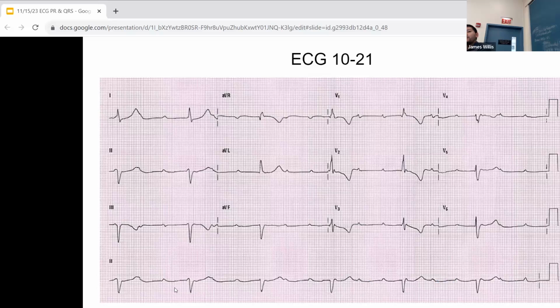So this would be great to determine in a patient. You could place the patient on telemetry and look to see if you can get more beats. Sometimes they'll have some grouped beats and you could determine if it's first or second degree. Then you'll know the difference. I would measure out the PR, and if it's the same, then I would call it second degree, and you can't tell type 1 or type 2.